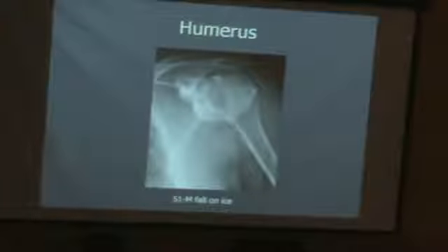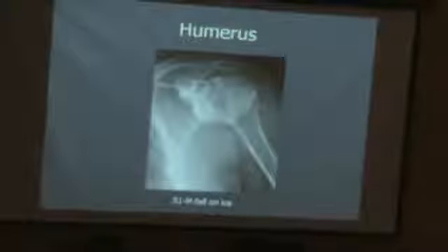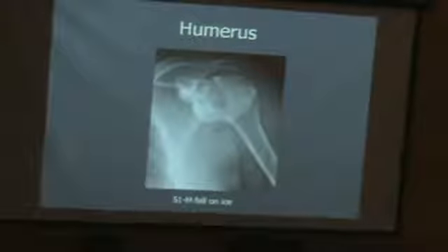And 1 week later, he came back with almost the same pain. The referring orthopedist thought that maybe it was something in his rotator cuff, maybe a rotator cuff tear or a labral tear. He said there is no fracture, so probably that's what is painful for the patient. They sent him for an MR arthrogram, and we started with the arthrogram.